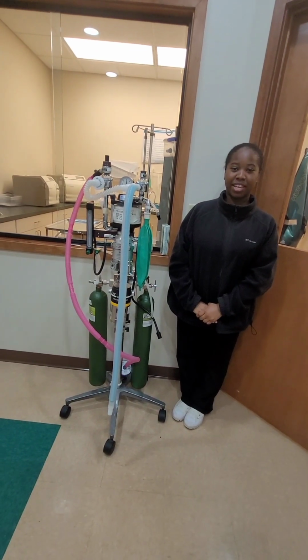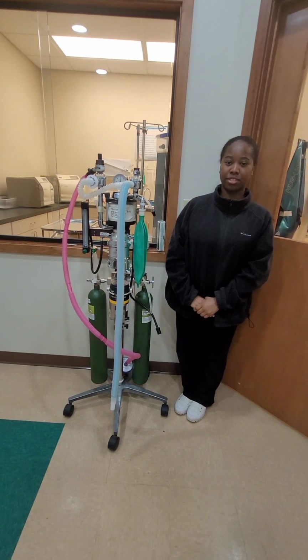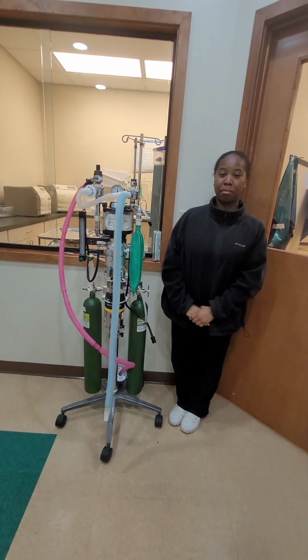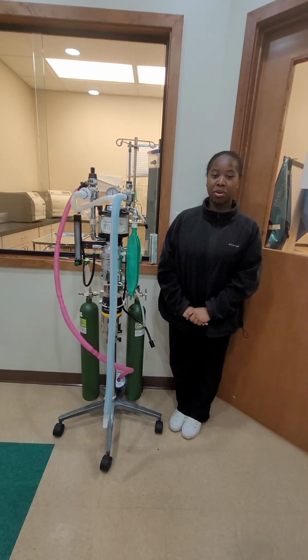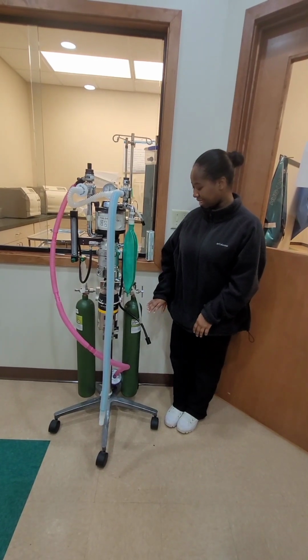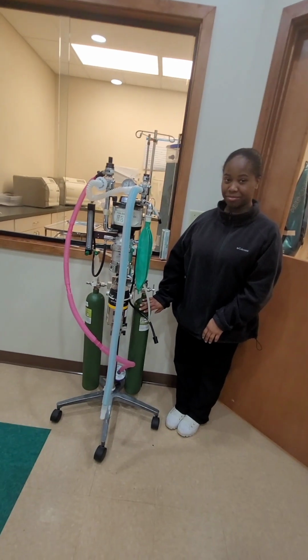My name is Diamond Fricks, and I will be going over the anesthesia machine components, the rebreathing system, as well as the non-rebreathing system. But first, I will discuss the rebreathing system.